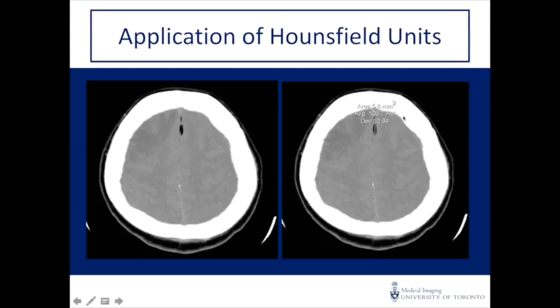So we know that this is fat. So this represents fat rather than air. This patient happened to have fatty deposition along the falx, which is not uncommon. If the patient had been involved in a trauma and you had just looked at this image, you might think that this dark spot represents air, and calling it a focus of air in the brain or pneumocephalus has very strong clinical implications. Again, this is another example of why it's very important to understand the basic principles of Hounsfield units and basic radiographic densities.